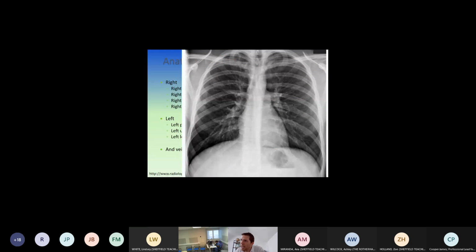It doesn't matter how you look at any X-ray, and this applies to musculoskeletal, abdominal, as well as chests. Everyone should have a criteria of how they review these chest X-rays, and like I say, it doesn't matter what area you look at, but as a general rule, the areas you need to cover are bones, pleura, mediastinum, hilum, the lungs themselves, the soft tissues, and then something called the hidden areas, the areas that tend to catch us out.